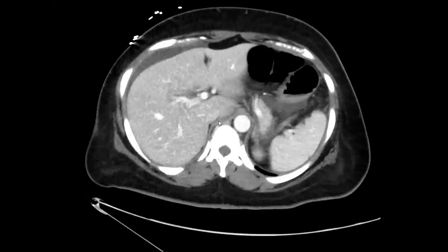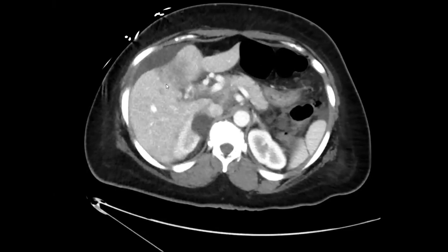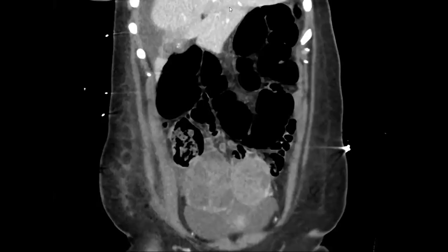So I just thought this was a good case, even though the history was leading you down one way. Always look at it and be like, if I just didn't even have the history, what would I call this, right? And this looks very suspicious. And then the pelvic stuff, I do think is tricky, and that's why MRI is so much better.